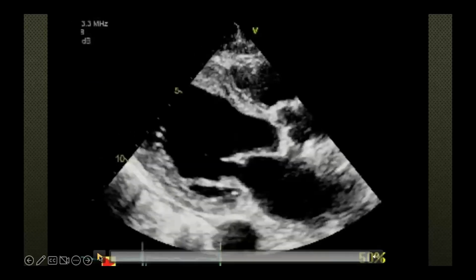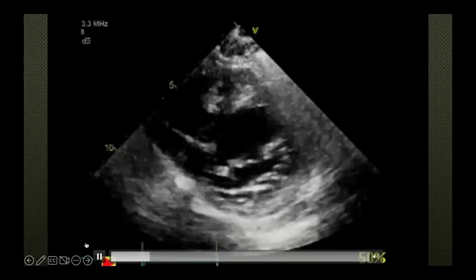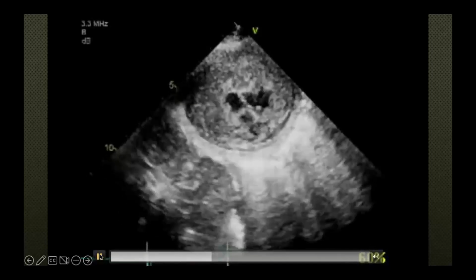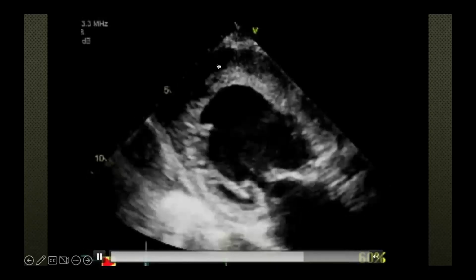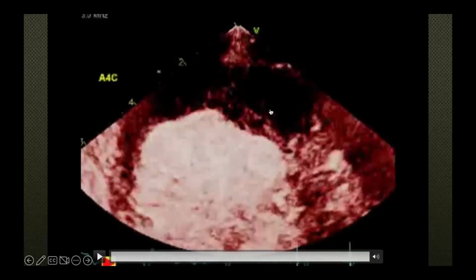And I have another case here, from a different patient, but it represents a more chronic thrombus, where if you look here in the short axis apical views and the four chamber views, there is a layered or more sessile hyperdensity with filling defect, and this is a clue of a more chronic or mural thrombus that develops in these cases.